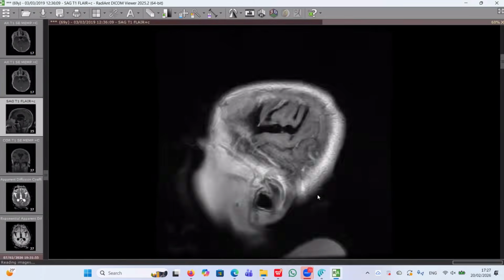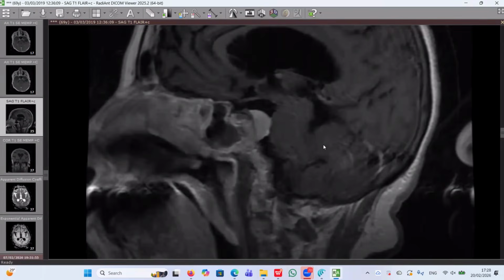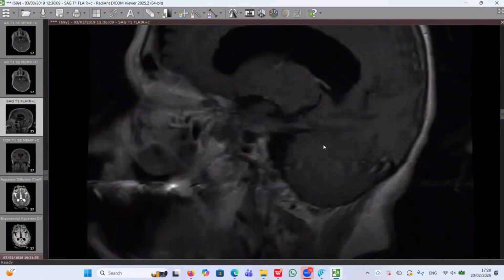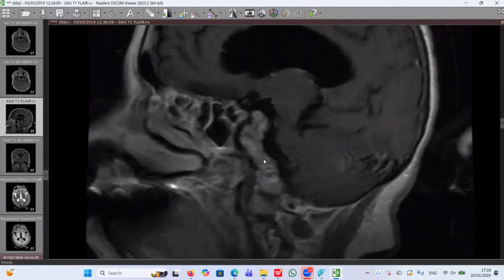Look for the sagittal. On sagittal, this is again an extra-axial location with dural tail appearance. This likely represents meningioma. Very nice. This one is considered really a typical case of clival meningioma. As you described, we have an extra-axial mass resting on, dural based against, the clivus. This mass lesion displays iso-intense signal in T1, slightly low signal in T2, with intense homogeneous contrast enhancement.